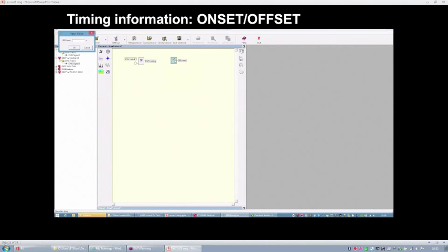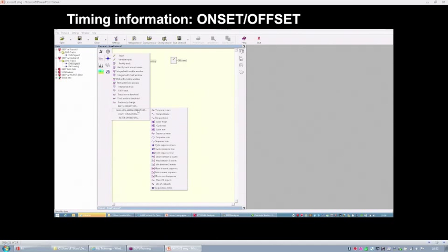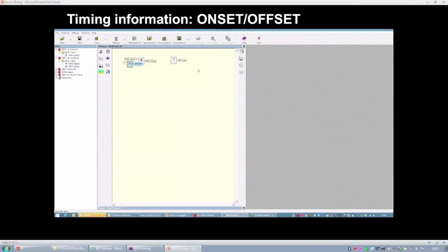You should already remember how to do that. I'm going to use 300 milliseconds as a time window to perform the root mean square. Now we can compute the mean value of the root mean square of the resting EMG activity. So this is the mean value and the standard deviation.